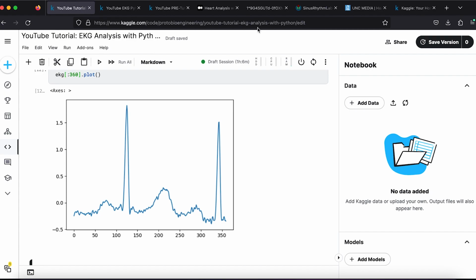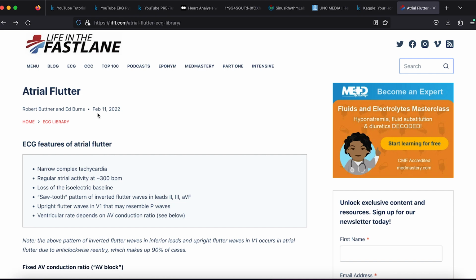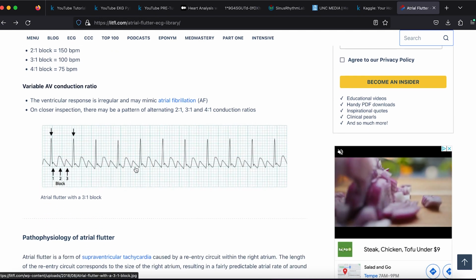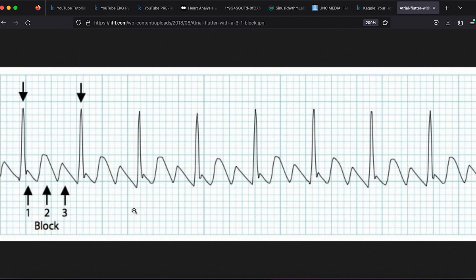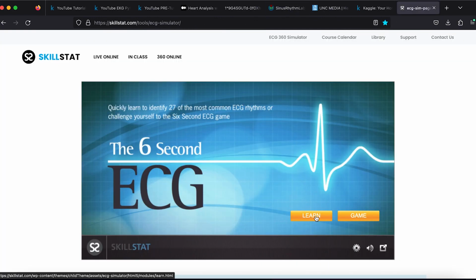As a preview, let's take a look at some arrhythmias, or bad heartbeats, bad EKGs. Bad EKGs typically will have an R wave or something, but then there's a lot of junk that happens in the middle. This isn't always the case, but for example, this is atrial flutter. It kind of looks similar to a healthy heartbeat, but there's actually a lot of junk going on in here. Let's quickly look at some really ugly bad heartbeats to show you what it looks like when things go wrong.